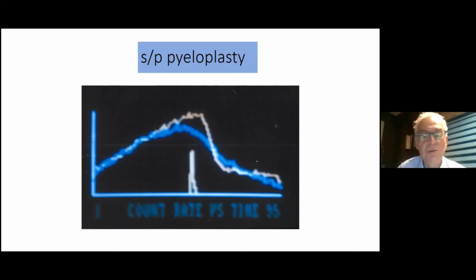No obstruction, correct. So this is very dilated, but non-obstructive system. So the normal renogram shoots up like this, starts to drain even before the diuretic, and then the drainage is accelerated. This is a very prolonged uptake curve. So these are both hydronephrotic kidneys. But once you give the diuretic here, you can see excellent washout of both sides. So these are both dilated, classic dilated, but non-obstructed kidneys.